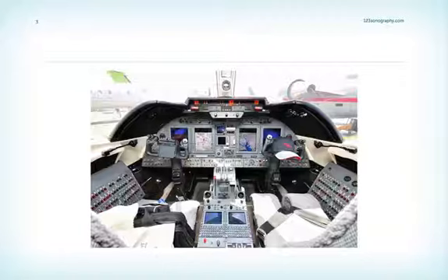But still, you need to know at least some basics. The keyboard of your echo machine is like the cockpit of an airplane. And just like every airplane has a different cockpit, every machine has a different keyboard. But the general features of the keyboard are the same across the different ultrasound platforms. And even though some machines have 1,000 functions, some hidden behind touch screens and buttons and who knows what, in reality you will only be using a few.